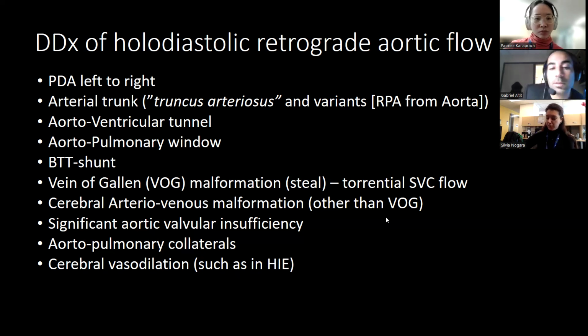I wonder sometimes, is it a safety mechanism to provide more perfusion to the brain, favoring the flow going to the brain even in diastole? I have no clue. But I can tell you that we see it clinically.